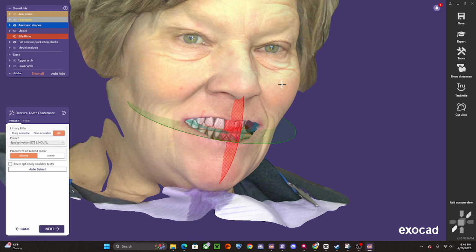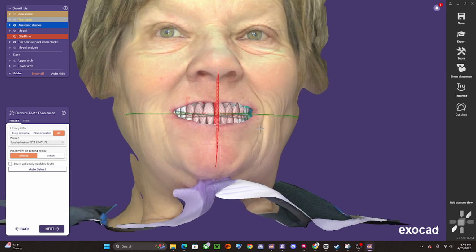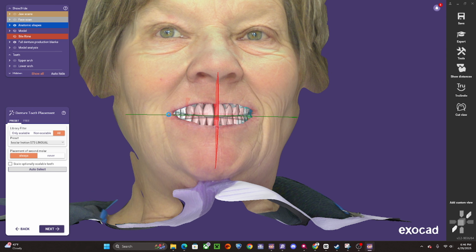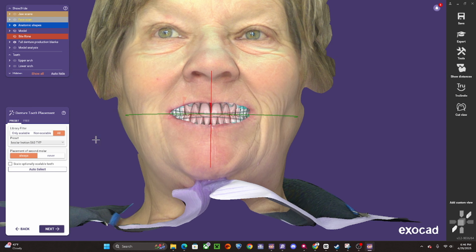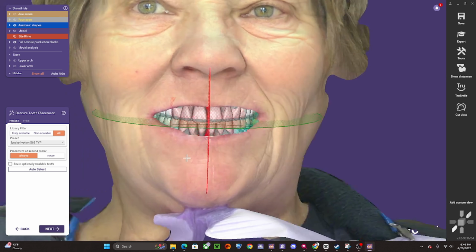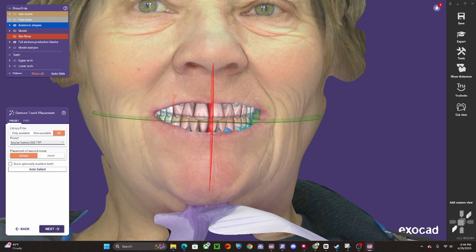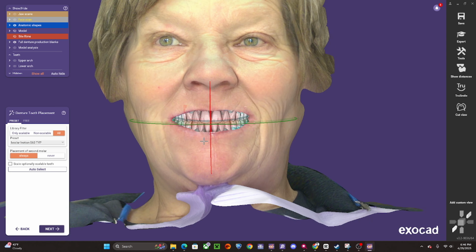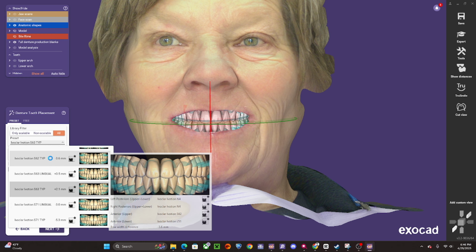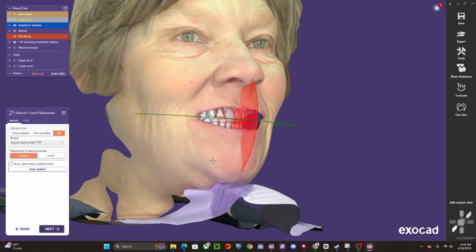Okay, so I think that would also be a crucial time to turn on your face scan that we have cropped the inner mouth for. And we can auto select teeth for our patient. There's auto select here. Now we can go with a round mold for her. We can go with a flat square mold. What I really enjoy doing, especially when having face scans, is flipping through our molds and finding the best mold for our patient. Now this is a very predictable workflow when using face scan technology and smile creator technology.